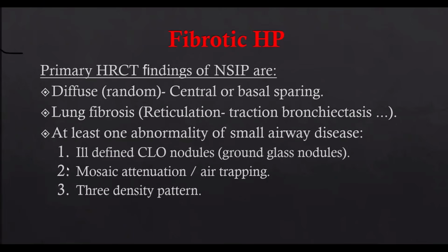The difference: mosaic attenuation, you can see in the inspiratory phase. Air trapping, you can see this one in the expiratory phase. Three-density pattern, as we saw before.